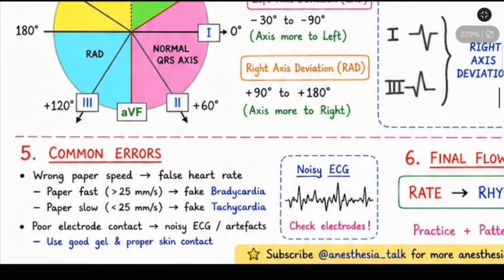Now let's finish with some common mistakes. The first mistake is wrong ECG paper speed. The normal paper speed is 25 millimeters per second. If the paper speed is more than 25 millimeters per second, the ECG appears stretched, making the heart rate falsely slow and producing fake bradycardia. If the paper speed is slower than 25 millimeters per second, the ECG appears compressed, giving a falsely fast heart rate and producing fake tachycardia. Always check the paper speed before interpreting an ECG.